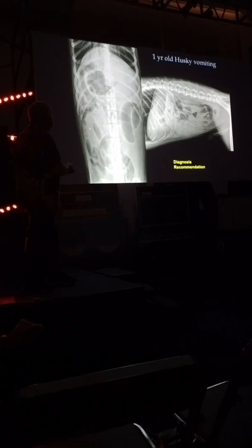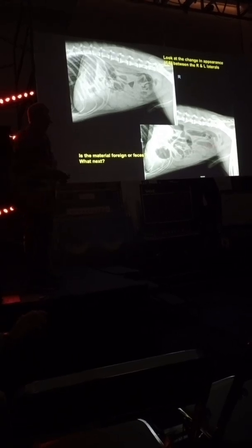So here's that area here. Here's that area right there. And remember, I also told you the other day, look at the pattern of the material. This has a nice linear pattern. Let's magnify.